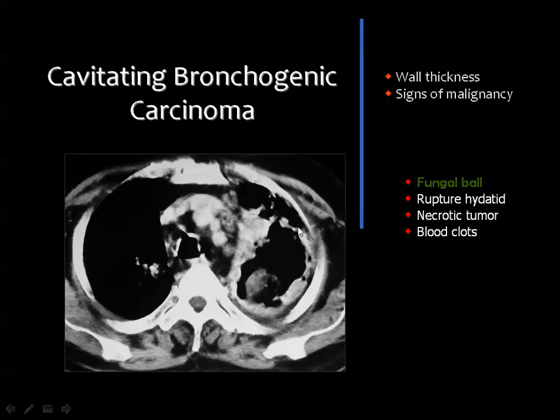This malignant cavity may contain only air, may contain a mass and air, which is the shreds of the tumor, and may contain an air fluid level as well. All these findings are not considered in the diagnosis if you see that the lesion has a thick margin with irregular inner wall, indicative of a malignant cavity. Also, you can easily appreciate the enlarged mediastinal lymph nodes nearby to the cavity.